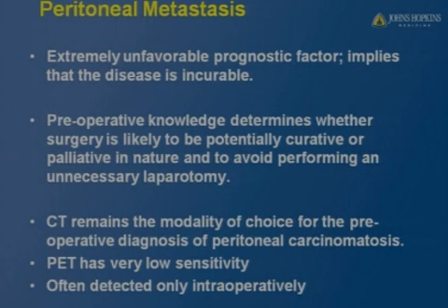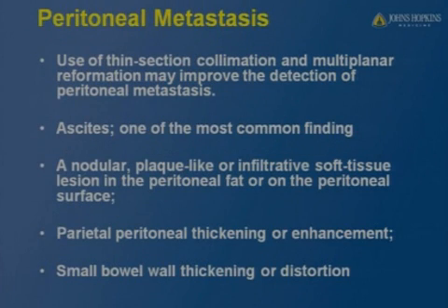Peritoneal metastasis is an extremely unfavorable prognostic factor, implying that the disease at this point is incurable. If we know that preoperatively, we can avoid performing an unnecessary laparotomy, and we can decide if the surgery is going to be potentially curative or palliative. CT still remains the modality of choice for the pre-op diagnosis. PET unfortunately has low sensitivity, and these are only detected intraoperatively.